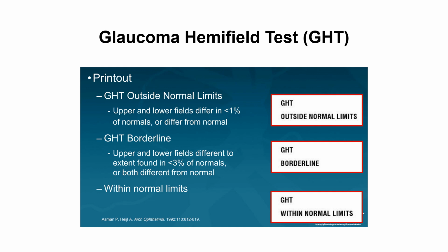That this difference is found in less than 1% of normal patients. And the glaucoma hemifield test in this patient is 99% abnormal.